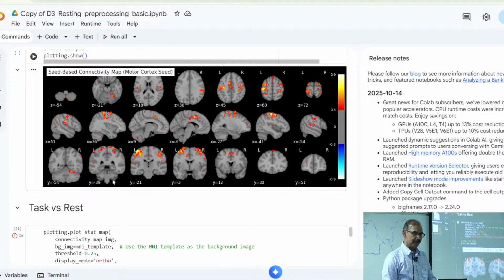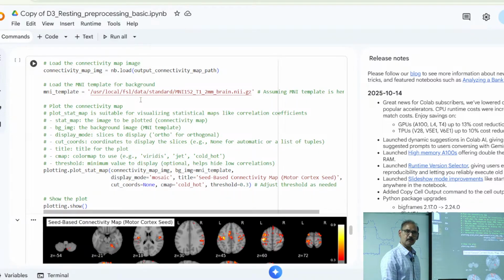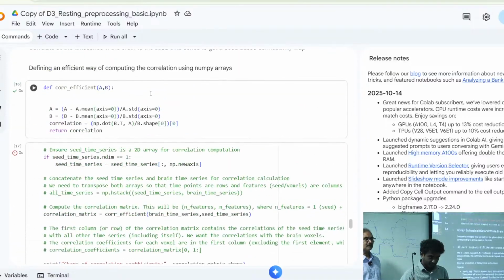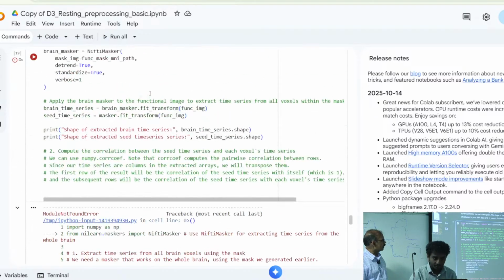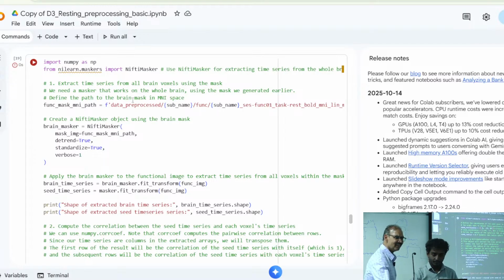All right. Maybe Joshua, can you come here? So Joshua has been able to do it for the other coordinate also. So he's going to show you how to do it. Come. You used 8. It's not running. Is it? Oh, wait.